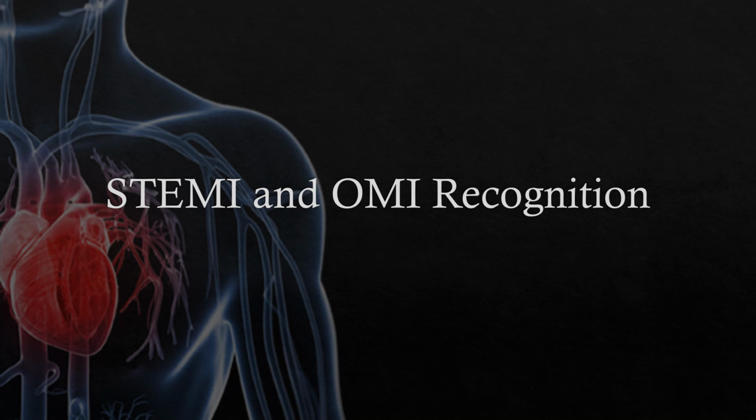Hey everyone, today we're going to talk about utilizing the ECG to recognize STEMI and the more recently coined term OMI, for occlusion MI. Those are patterns that don't present with the traditional STEMI criteria, but still manifest with the same underlying diseases, have the same mortality and time-critical nature to them. So it's vitally important that we recognize those as soon as possible so that we can get them to definitive care.